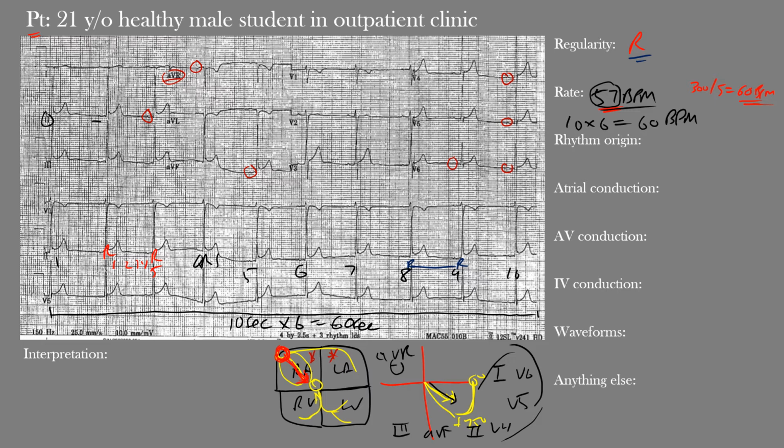So let's do that here. You can see a slight P wave there, a QRS. There's another P wave and a QRS. P wave, QRS, P wave, QRS. And if you went through this whole thing, there's a P wave and QRS throughout, a 1-to-1 ratio of one P wave for each QRS complex. Because we met all those things, we do in fact have sinus rhythm here.